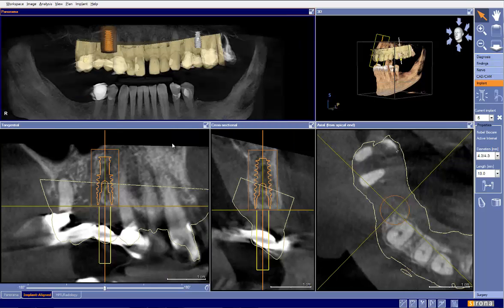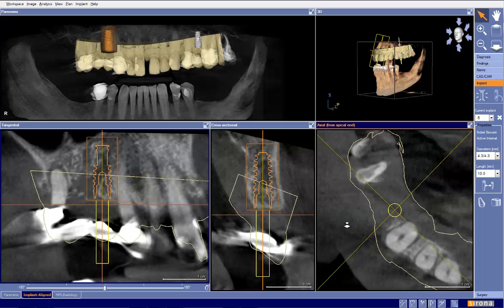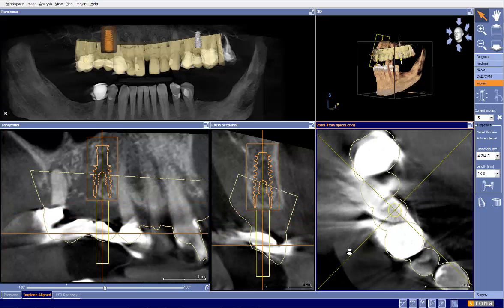So we'll go here to the implant align view. And one of the things that we look at, what I like to do for overpartial, and this is how this is planned, is it's planned a little bit lingual. I like to do that because one, you have the space of the implant, then you have the space of the locator abutment or O-ring or whatever abutment you're using, and then the housing that goes on top of it. So by the time all of that is put in, I don't want to thin out the aesthetic area of the partial tooth so much.